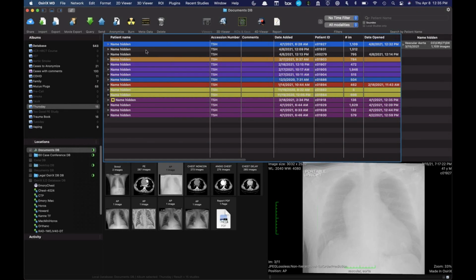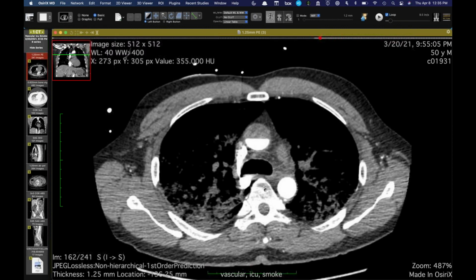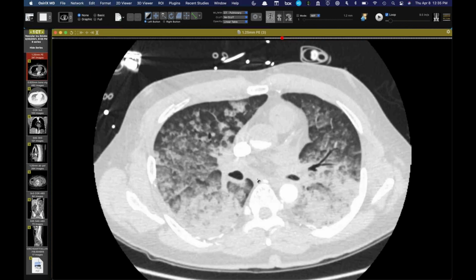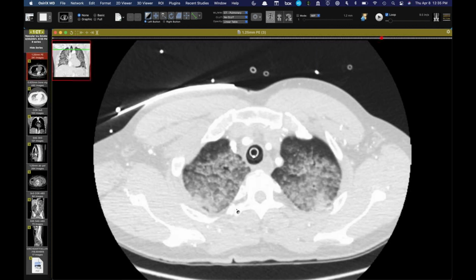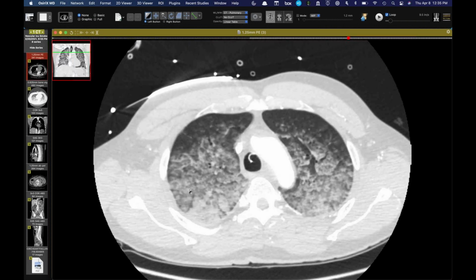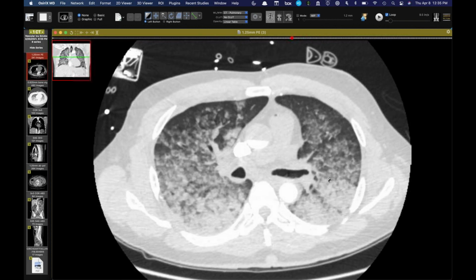So this is an interesting case, and I think Howard's probably shown the most cases of this type of phenomenon. This is a patient who came in a few weeks ago, was found down. I'll start with the lungs, because within the last year there was that nice paper in Radiology: Cardiothoracic Imaging describing the dependent lobule sign with pulmonary edema, where fluid is just dependently layering in individual pulmonary lobules.